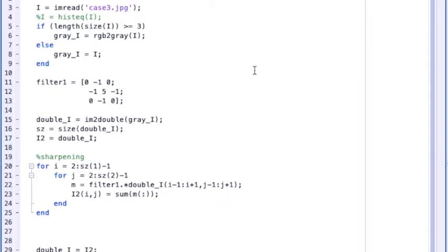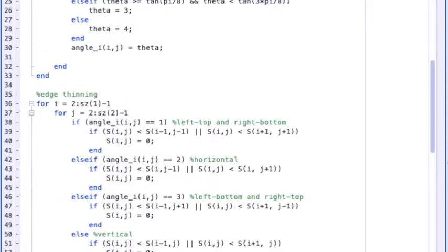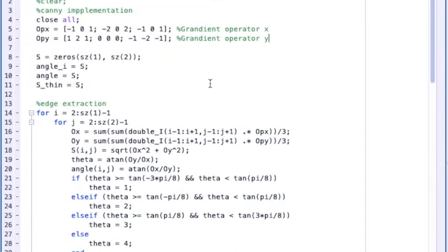The first step of the curvature scale space algorithm is to extract the edges of the bones from an X-ray photo. We tried many different edge detection algorithms, but Canny edge detection proved to be the best one. Because most X-ray photos are not clear and always come with organs and muscles, the tissue caused errors in the Canny edge detection, resulting in many broken up edge pieces that aren't part of the border.